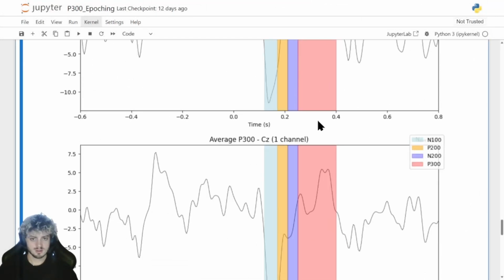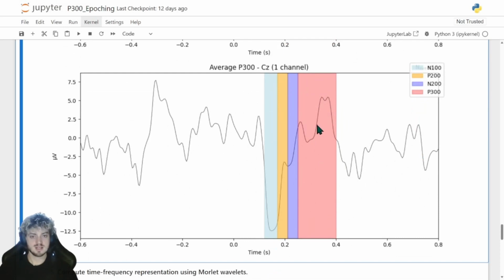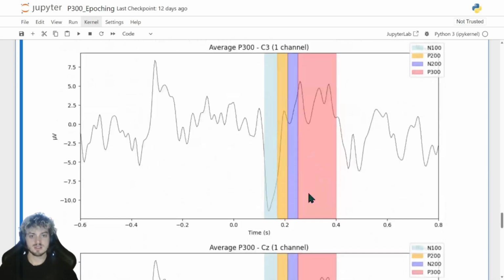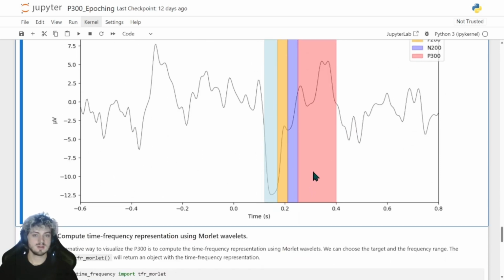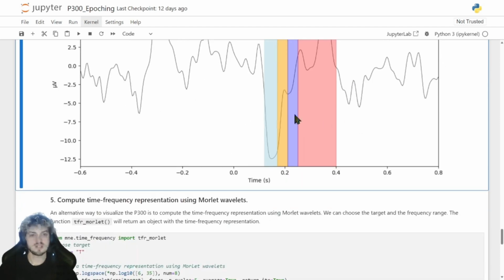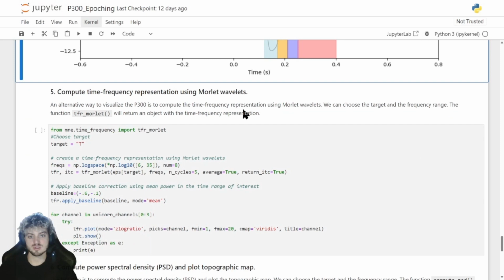weaker. And this is CZ, right? So as you can see, there are some differences. Which channels to pick is basically up to you during the classification. So you can first start with all of the channels and then systematically exclude those who do not contain enough information in your opinion. But I always recommend starting with all of the channels that you have at disposal.